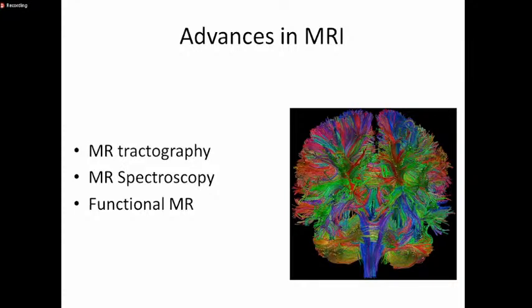And this helps you when you are dealing with tumors, for example, and you want to do surgery, with nerve bundles. Then you can be able to look at that and say whether the tumor is really damaging or just displacing. If they are just displaced, you can remove the tumor and the patient's health will be restored. If they damage the nerves and the bundles, then you have something different.